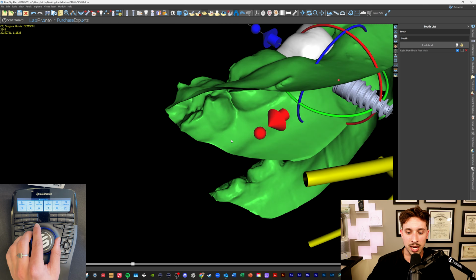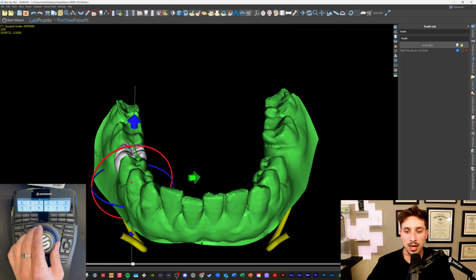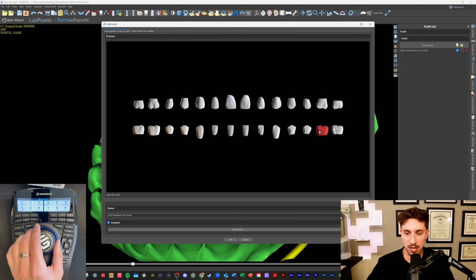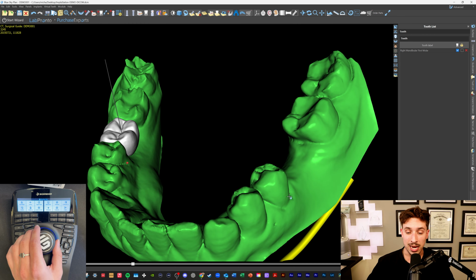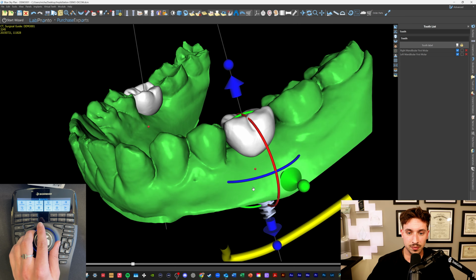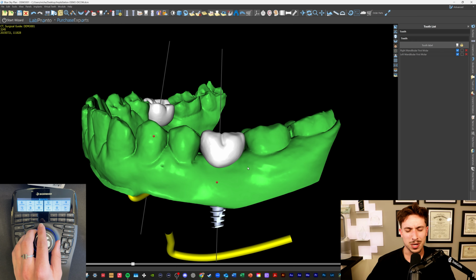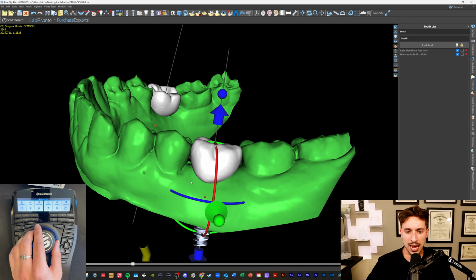And then I'm going to click on exactly where I want it. And then you can see it just pops right in with the implant. Okay. Now I'm going to do the same thing for the other side for tooth number 19 over here, and double click and boom, it's in. I'm skipping through the load times for this just to make it a little bit of an easier watch, but it's pretty fast. So let's analyze these wax ups.